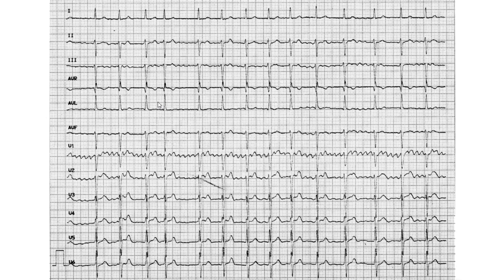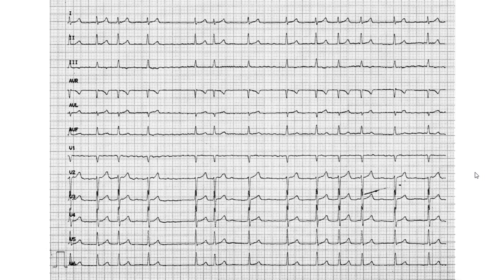That's points 1, 2, 3, 4, and here we're going to stop at this point, and we're not going to calculate the PQ interval, of course. So that is that example, and what is the next example? This is number 18. Okay. And you may pause. This is question 18. Whenever you're ready, you can replay.